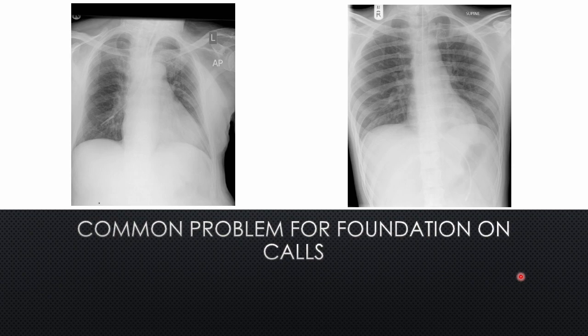Alright, so this is a very common foundation year scan or dilemma you'll be faced with. Nursing staff will come to you and ask you if they can use the NG tube. So pause the video, see if you can find it in both the left and right scan and see if it's in the right position.